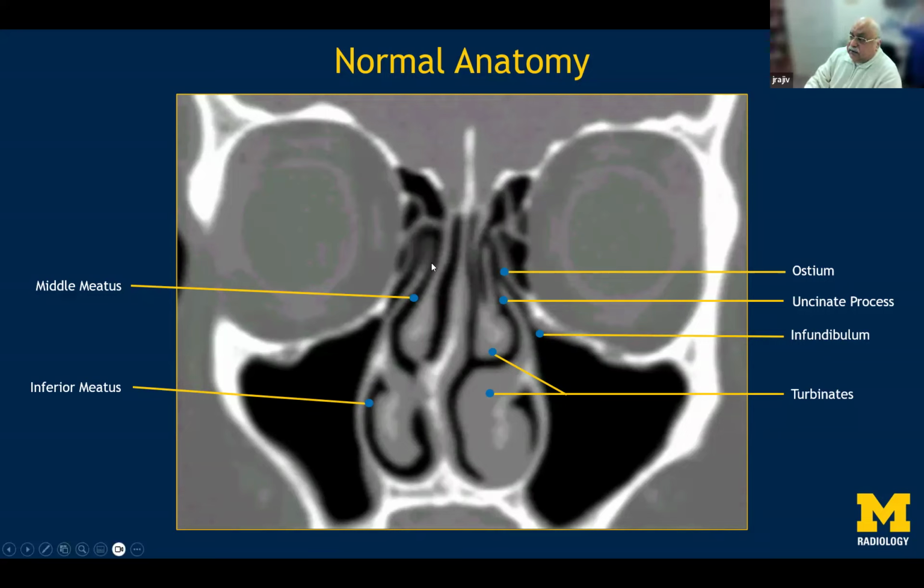So if you break this one, you land up in the next level of obstruction, which is the anterior portion of the ethmoid sinus. So you can go back and do an anterior ethmoidectomy by taking out the mucosa of those air cells and grabbing it, and stay as close to the nasal septum as possible rather than more laterally towards the medial wall of the orbits.